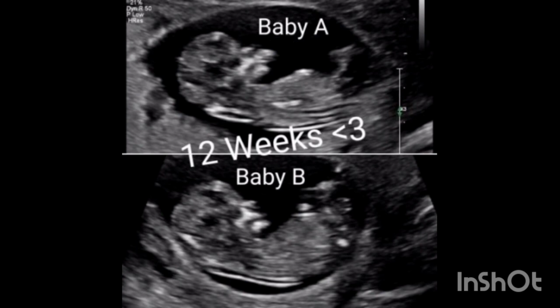Measurement of the crown rump length can easily be done at the time of the first trimester scan, 11-14 weeks of gestation. Later in pregnancy, correction of gestational age should be avoided, since growth curves in multiple pregnancies differ from those in singleton pregnancies beyond the second trimester.